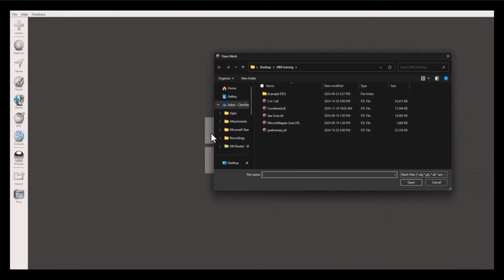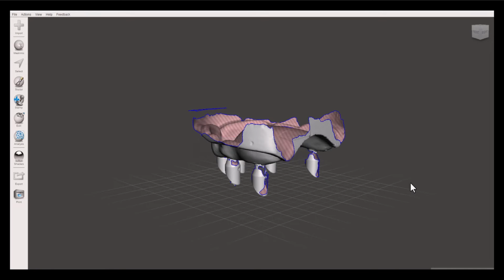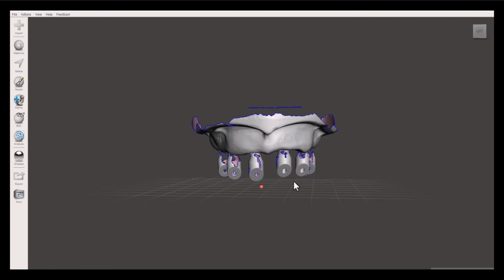To begin, press on Import. Select your jaw scan and finish importing. Once the scan is loaded, you can see it's aligned to the orientation that it is in the bite. Our goal is to avoid changing the position of the jaw and change photogrammetry output to align the scan bodies.